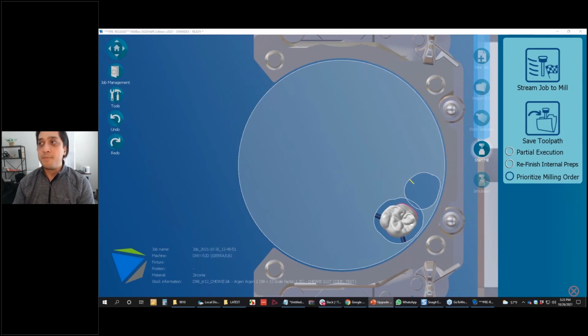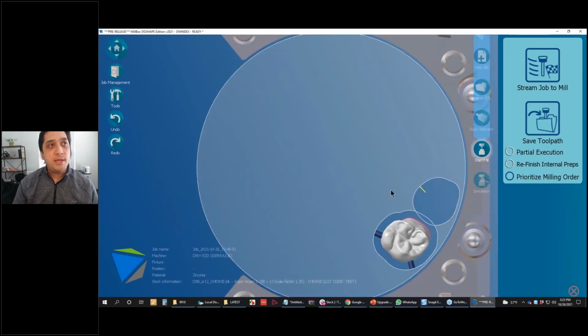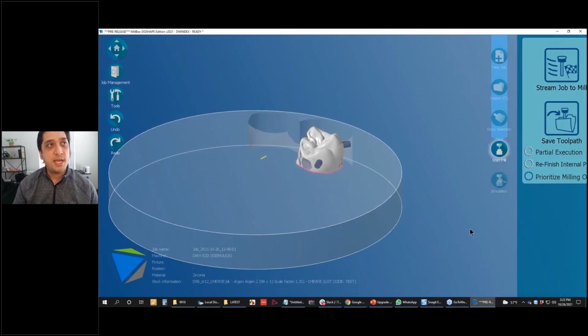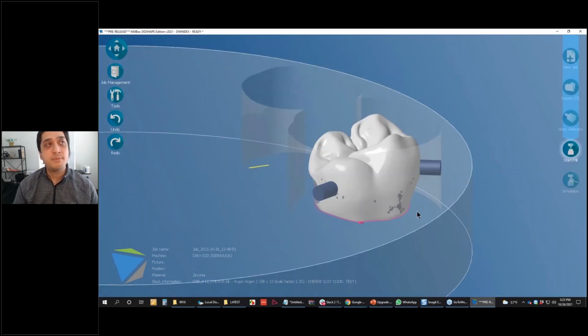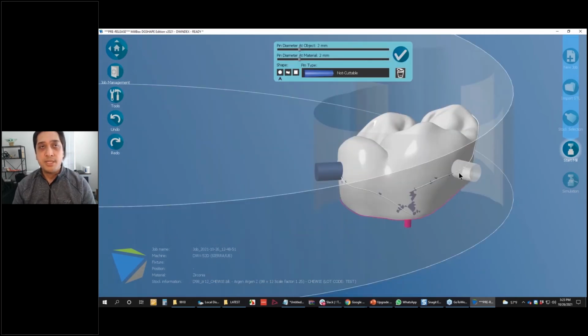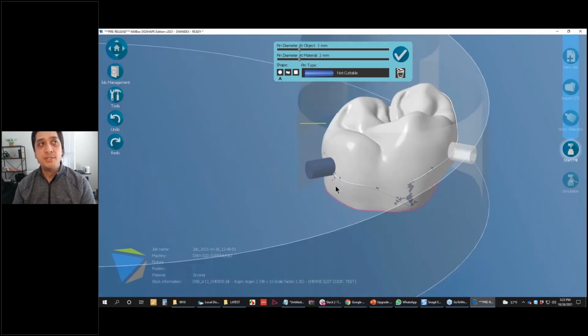Okay, and the last, but certainly not least, item that we want to talk about is our smart support pins. So let's discuss how that works, or our various different types of support pins, not just the smart ones. What you see here are standard round support pins, and this is not going to be news for those of you using MillBox or Sun 3D. We've always had these shapes.